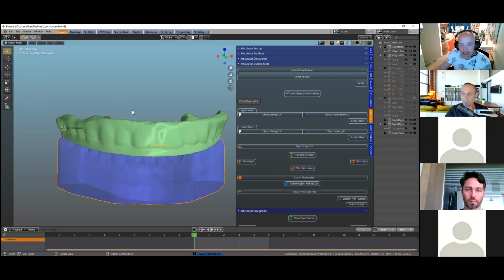It's a little bit like if you're going through the woods and you're lost, so you put stones along the pathway as a safety mechanism so that you can get back to where you started. We're doing exactly the same thing in Blender. Always save your file so that you can go back a step.